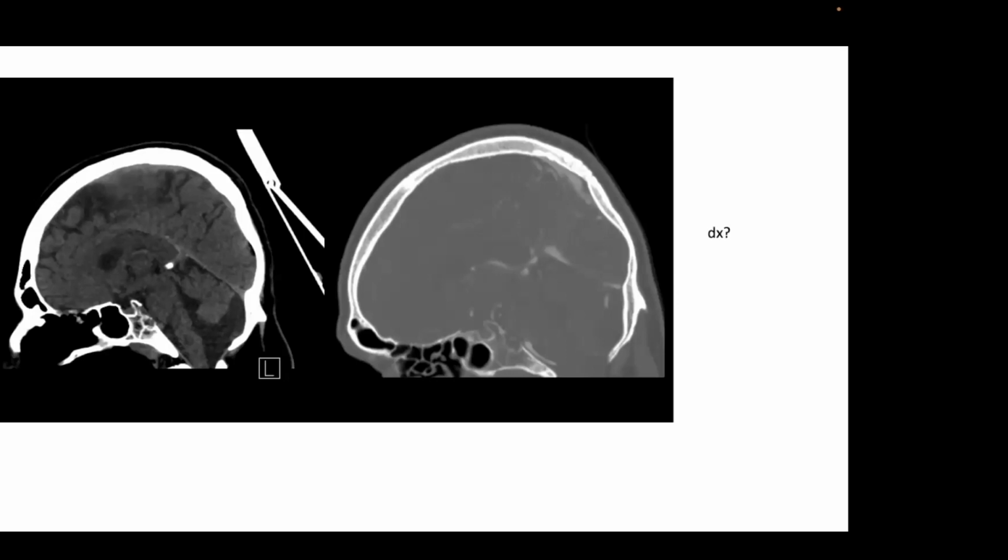Anybody? It can be a metastatic lesion. Okay, there are two arguments against a metastatic lesion. Number one, the bony change is sclerotic at its margin, which tells you that this lesion is not destroying bone, it's remodeling bone, okay? The second reason is it didn't enhance. All metastatic lesions enhance, basically. So it's a reasonable thought, but not the correct diagnosis here. What else should we consider? I'm going to tell you, this is a typical appearance of a rare disease. You may never have seen it, but I want you to see it today.